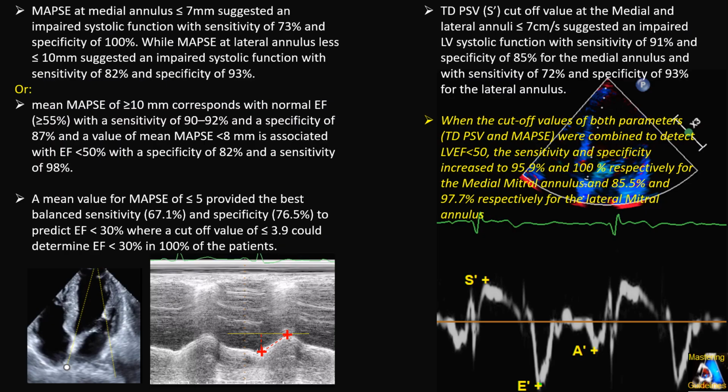At the end, I would like to add another tip related to measuring Simpson and ejection fraction, and that is the M mode of the mitral valve and S prime, or systolic velocity of the annulus of the mitral valve.